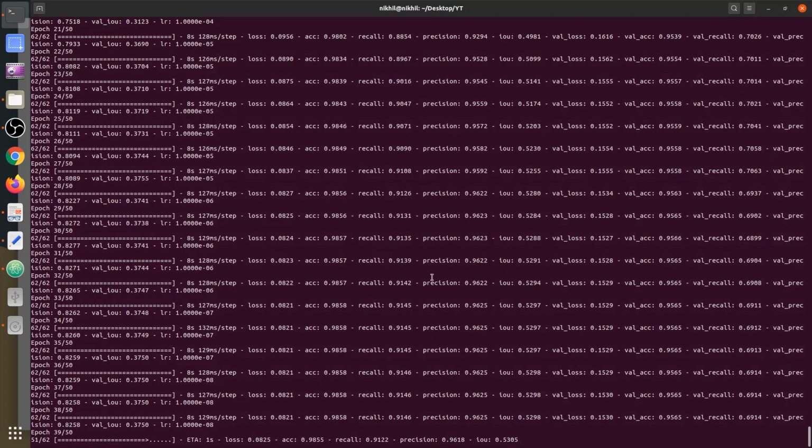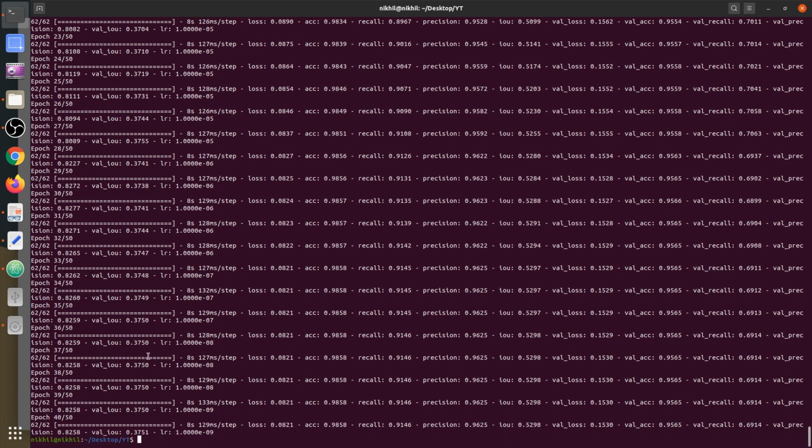Let's see. Okay, our training is still going. And only 10 epochs left. Okay, so it stops improving, so that's why the early stopping has stopped it. So it nearly stopped improving at 30. So validation loss at 30 is, let's check, 1527. So the model hasn't given us a good result.